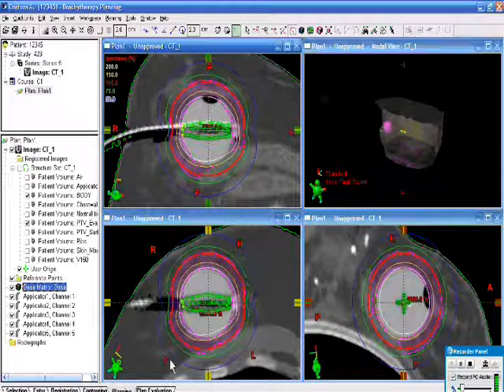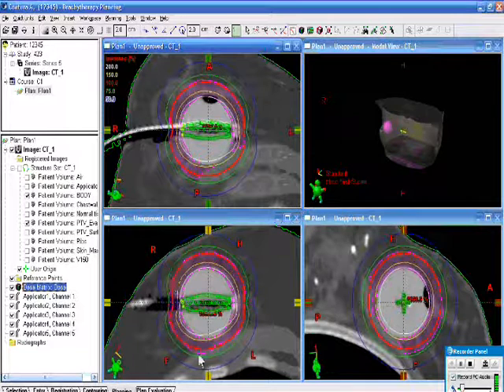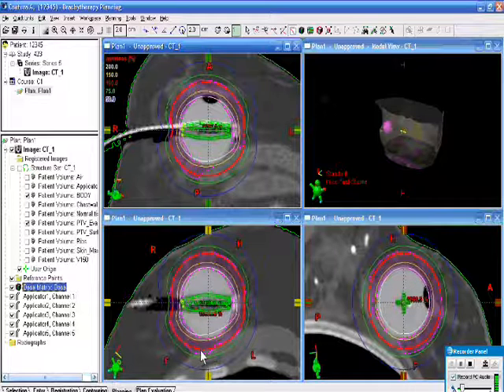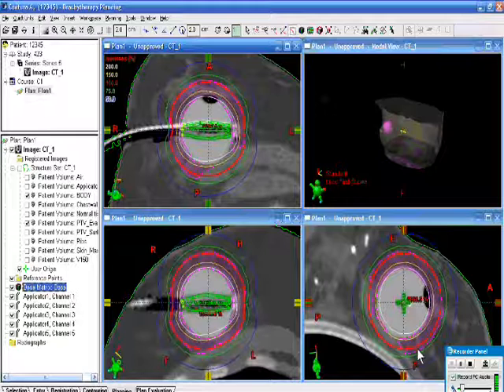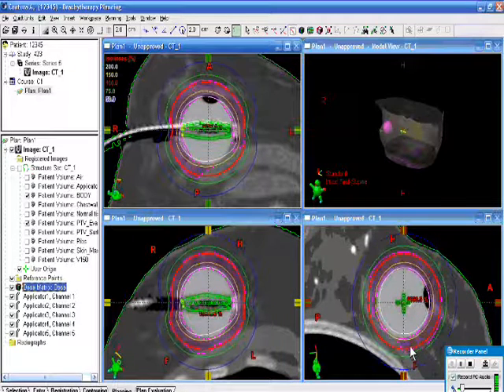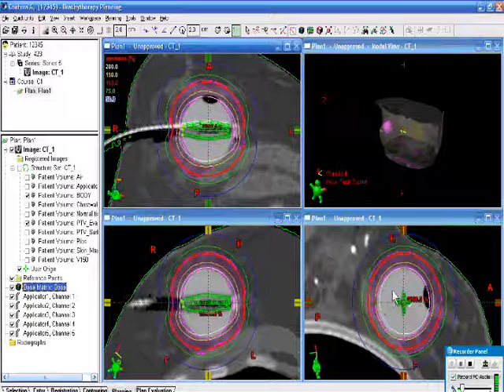Likewise, in this view, 100% isodose here conforms really quite well, even though our PTV is slightly irregular here. In the transverse view, in this case, there's a little bit here, but whether or not this is significant, we need to check the volumes instead, and we'll use the DVH for that. But in general, this one looks pretty good.